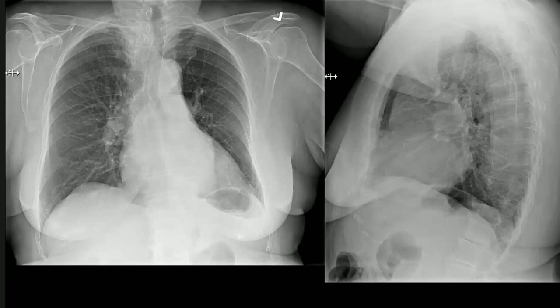What's happening distally? So the diaphragmatic contour is intact. However, there is a radio opacity in the retrocardiac region, but as the lung volume is reduced on the left side, it can be an endobronchial lesion in the left bronchus, inside the left bronchus. So I would like to confirm it on the CT chest with contrast.